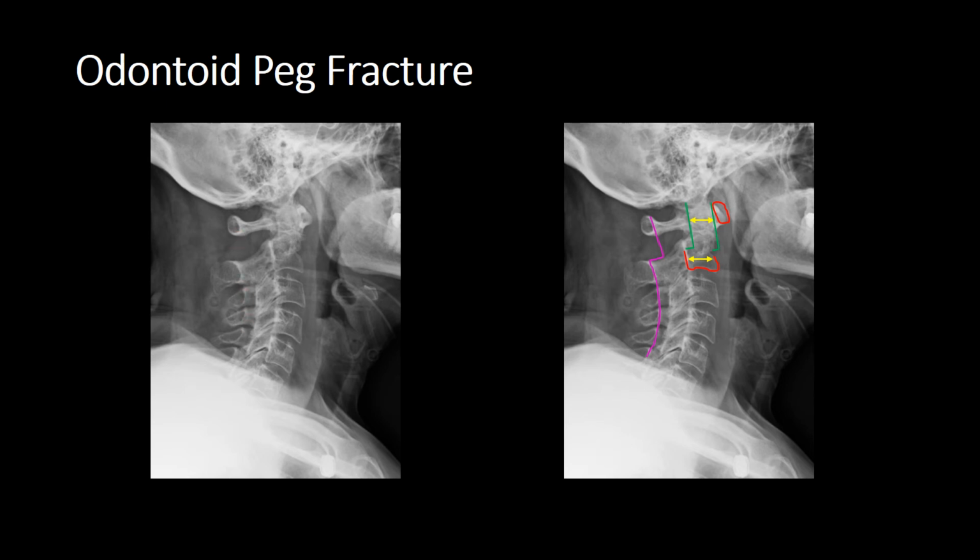B. B is for bones. No fractures in the base of the skull. Mandible looks okay. Anterior tubercle. C over the odontoid peg. There's a fracture. So we've got a fracture through our peg. There's the vertebral body C2, vertebral body C3, 4, 5, 6.